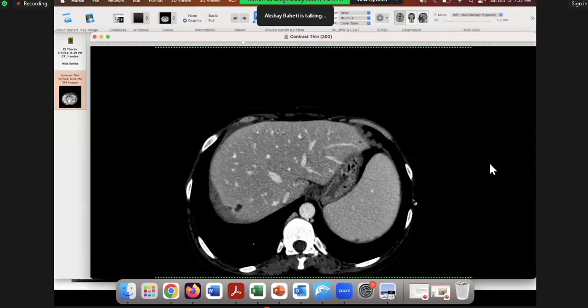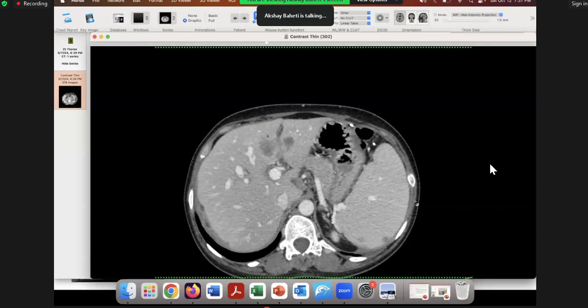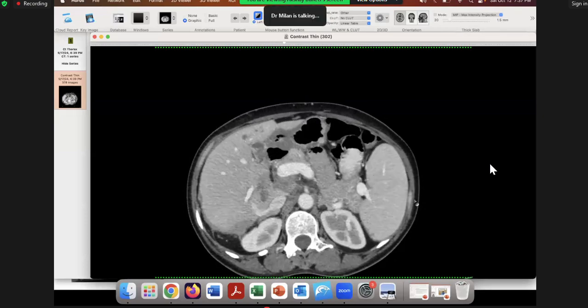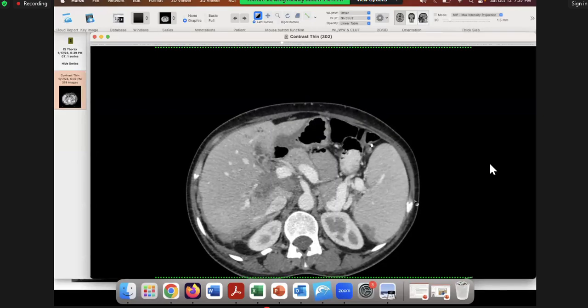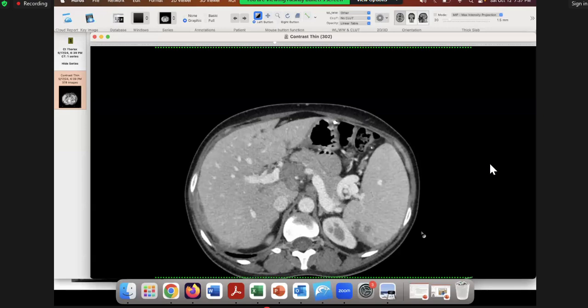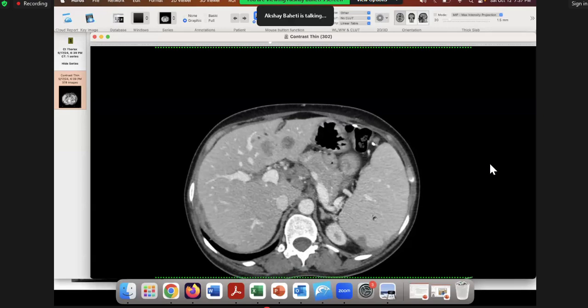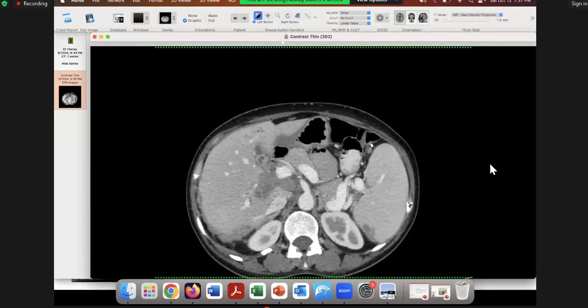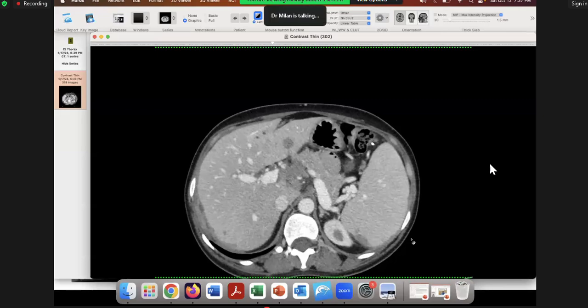I'm not sure. What about the spleen? You think there's anything intrasplenic or is it all surface? So it's all surface. Just to clarify, surface can invade the parenchyma, and that's still stage 3. It's only when there is nothing on the surface, it's pure parenchymal, then we call it intrahepatic. Okay. So what do you think this is? Is it intrasplenic or is this surface? So it's on the surface. Excellent. Very good. What about this one? So it's also surface only.